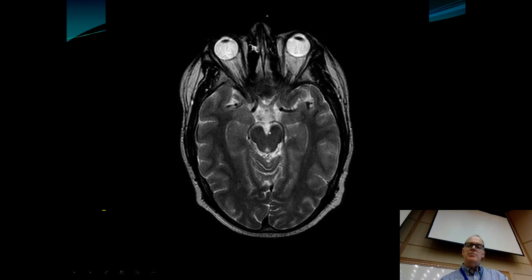Now this has more of a classic appearance of the midbrain with the Mickey Mouse ears. So these are the cerebral peduncles. Cerebral aqueduct. Okay, remember flowing blood looks dark, so what we're looking at here is the middle cerebral artery, which is tortuous, right? It's kind of going up and down as it moves out through the Sylvian fissure, and so on a single section, that's why we see it here, then it disappears because it looped up or down, and now it appears here again. Okay, so everything you're looking at out here, these are little loops of the middle cerebral artery. Okay, again, parahippocampal gyrus out here, and these are the optic radiations. Then going back to the occipital lobe.